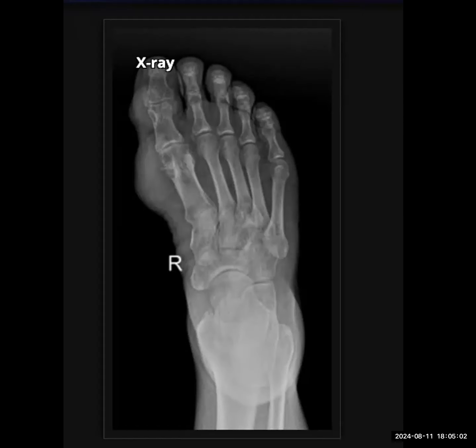Okay. Provided to me is an anterior-posterior view X-ray of the foot. I'm trying to see if there is any abnormality that is striking to me. Yes, so I can see that there are subarticular erosions noted on the first metatarsal. Also, they are present in the proximal phalanx of the big toe. And there is associated soft tissue opacities adjacent to the metatarsophalangeal and the interphalangeal joint.